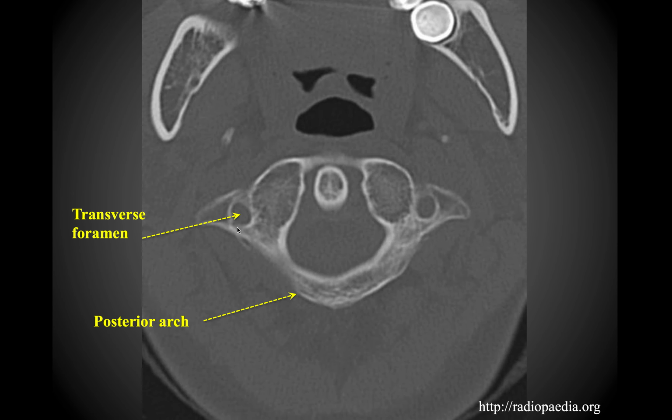And then here we can see the transverse foramina, which again, you can appreciate here how you really aren't able to make out clearly, at least, the vertebral artery. If you look really close, you can kind of make out the wall of it, but again, it's not obvious on a CT scan like this. You can also see up here some dental implants causing diffraction of the x-ray beams. And then back here, you can appreciate now the posterior arch of C1.